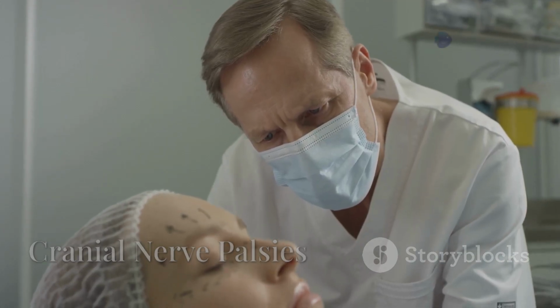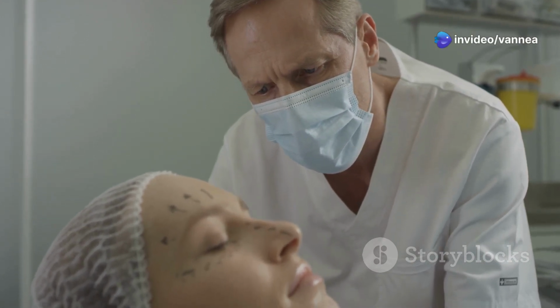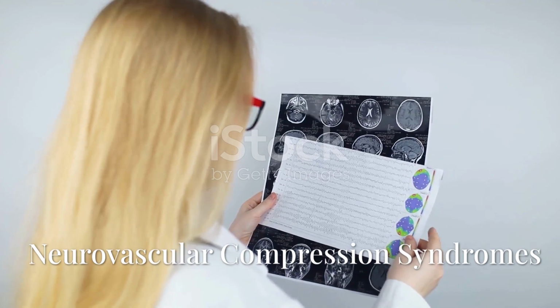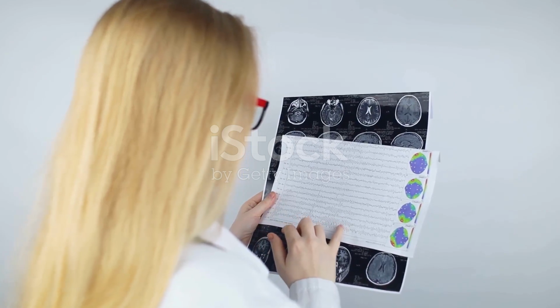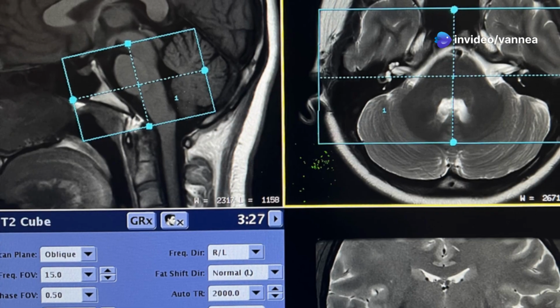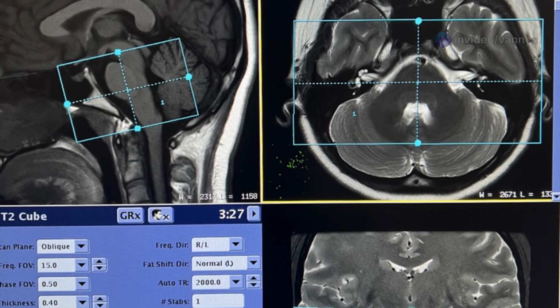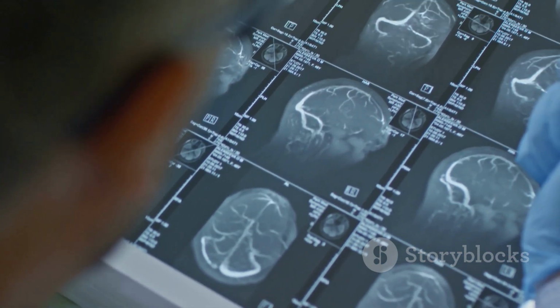1. Cranial nerve palsies. Identifying the cause of isolated or multiple cranial nerve dysfunctions, like facial droop, double vision, or hearing loss. 2. Neurovascular compression syndromes. For example, trigeminal neuralgia or hemifacial spasm, where a vessel compresses a cranial nerve. MRI with high-resolution sequences, such as FIESTA or CISS, is especially useful in these cases.